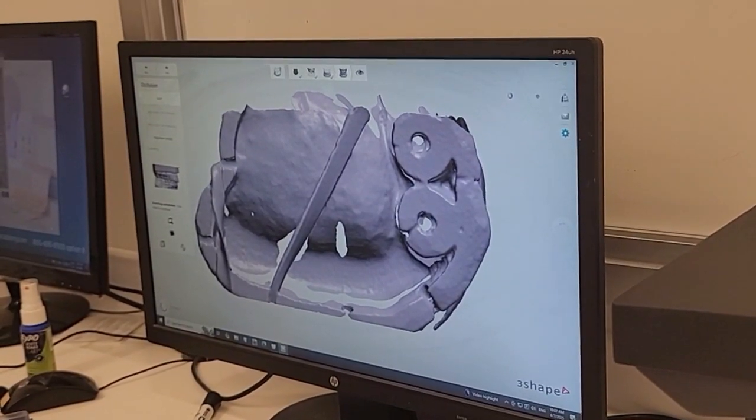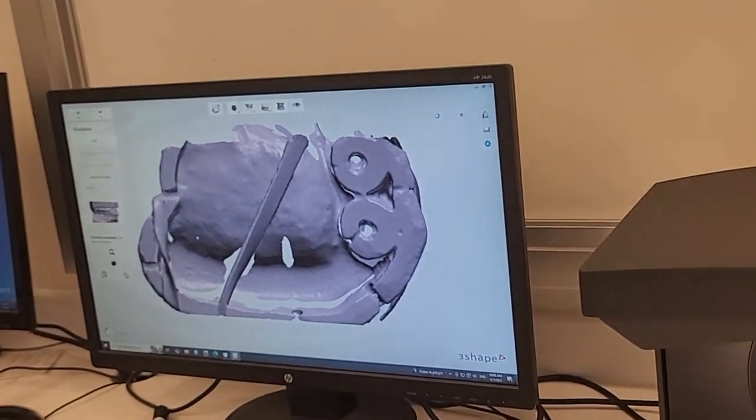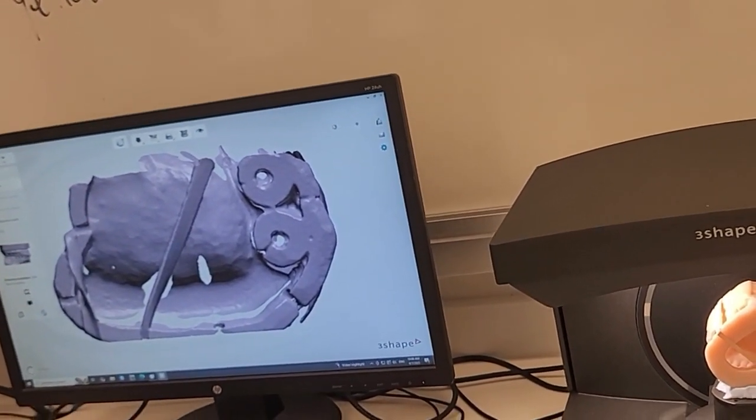And look at it, it's like a mumbo jumbo in there, and you're thinking, what the hell did you just do, okay? But this might work, and I'll show you how.